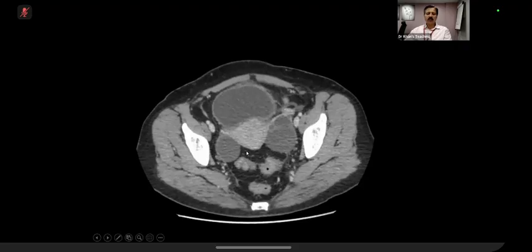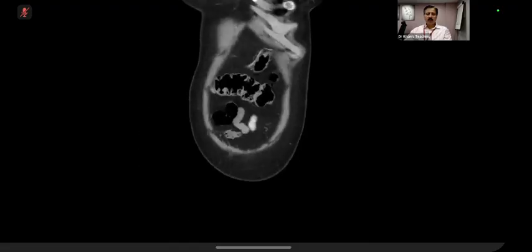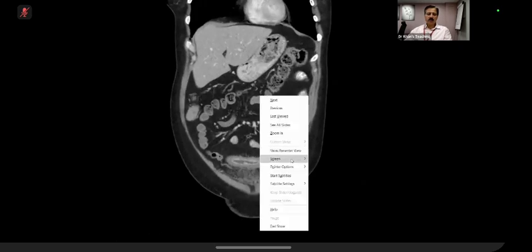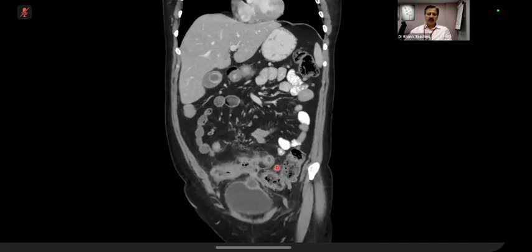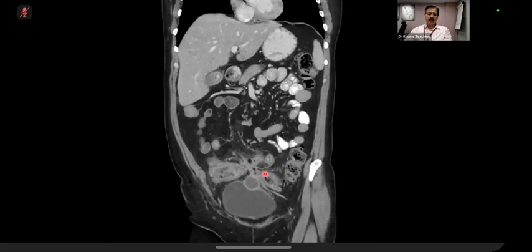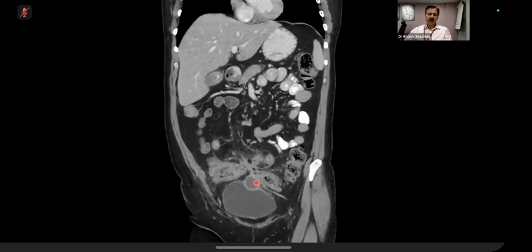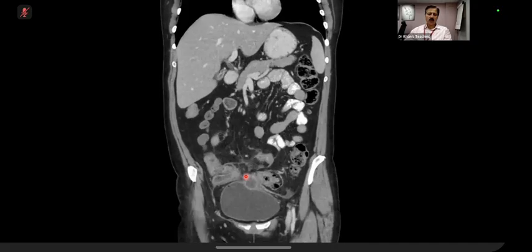I'm not interested in these ovarian cysts. These are incidental findings. Now, if you see this coronal, and again develop your eyes on this, a lot of fat stranding, and that Comb's sign, etc. And you can see this was that mesenteric abscess, and you can see how it is communicating. This is that abscess which is sitting on the urinary bladder, and this is the sigmoid colon.